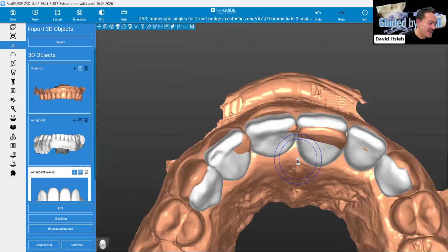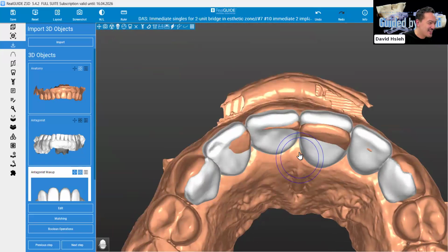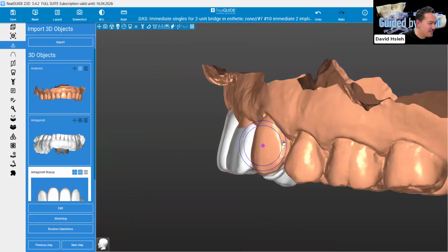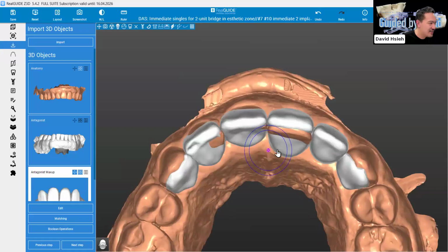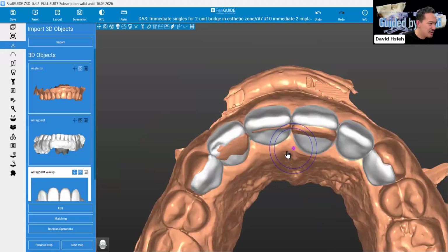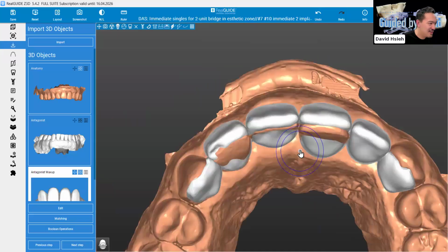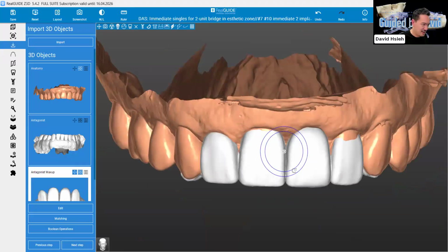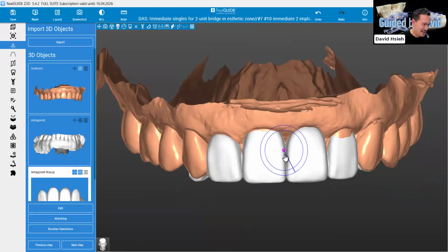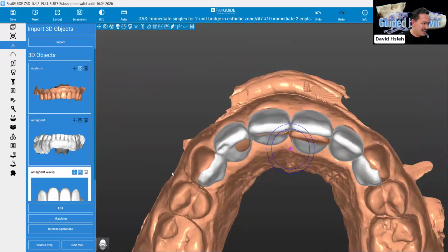If you know where the crown goes, then you can figure out where the implant should go. All right, so I'll just quickly do the wax up position for now. Let's just say we're happy with that. A little more. Yeah, let's just say this is the wax up, right? Actually, it's not, but you get my point. All right, so let's do that.